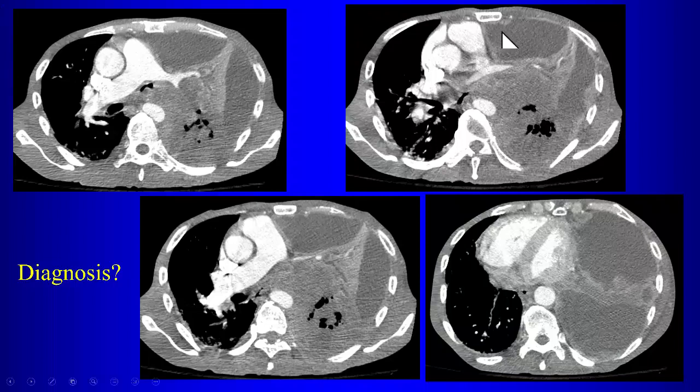So notice here, there's kind of nodular, it's asymmetric in terms of the degree of pleural thickening, also here. Okay? And then notice that there is some enhancement that seems to extend towards the mediastinal pleural surface. And if there's enhancement of the mediastinal pleural surface, that also is associated with malignancy. So can you see where the tumor is?